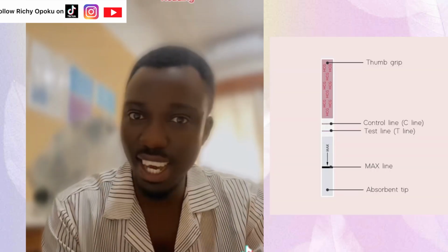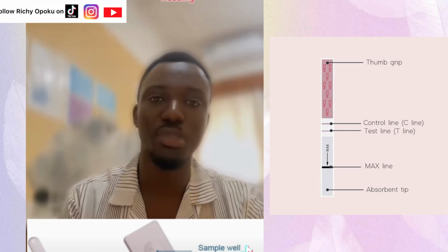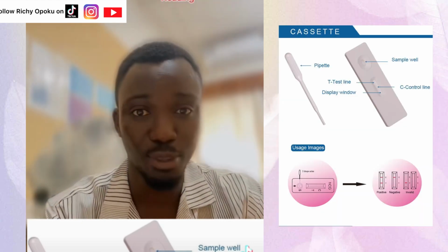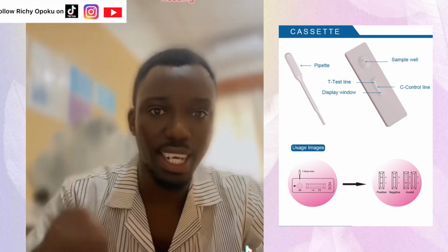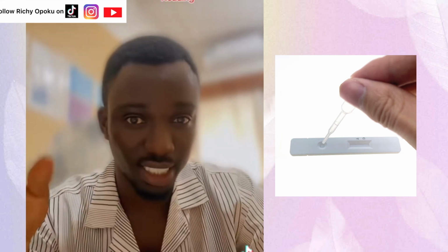And these letters are not just there. They represent something. They have meaning. The C there is control, and the T there is test. Each of them has its own role over there. It's not just there for fun. You need to pay attention to those things whenever you are testing for pregnancy. You normally have your pipette in there, except the strip that you actually insert into the urine. But for the cassette, where you put the urine in the well, you have your pipette to pick the urine and then drop it in the well. It is very important that you understand these things.